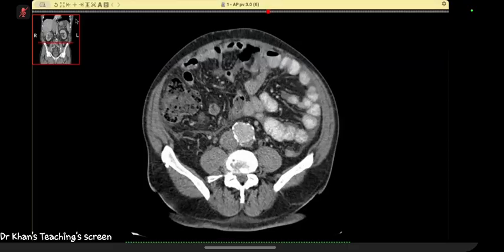So what are you worried about in the femorals? What worries you? Since there is proximal obstruction of the IVC because of the tumor extension, there can be stasis and there can be bland thrombus in bilateral femoral veins as well. That needs to be investigated with Doppler for further confirmation. Either she's developing any DVT.